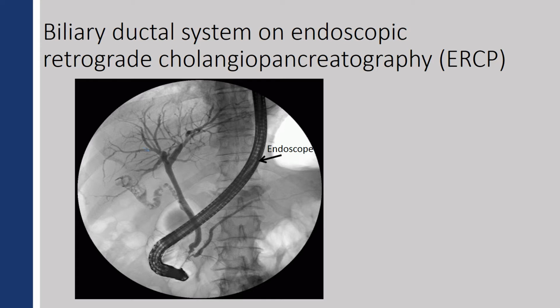Okay, this is what everybody hates. I'm not sure why. I think people, first of all, are probably not used to looking at it. But second of all, I think they make it into something more complicated than what it is. But that's the biliary ductal system.